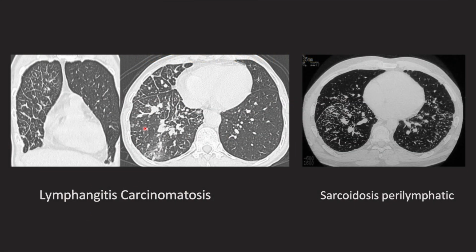Let's look at this CT scan of lymphangitis carcinomatosis and this CT scan of sarcoidosis, and you can actually note a difference right at the first go. What we can easily see is that sarcoid nodules are more consolidated at a point, at a region. So here around the posterior parts of the lung they are more, right? And the nodules in other differentials, like in this case lymphangitis, are more widespread. They are dispersed throughout the lungs. They don't have any topographic predilection as such, right?